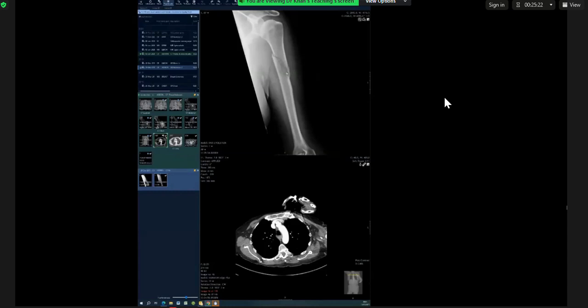So describe the fracture. Always say displaced, not displaced, stable, unstable, if that applies. It doesn't really apply here much, but you can say that there are cortical breaches on both sides. And you rightfully said there is a lytic lesion. Straight away you said the bone is normal, and then you said it's abnormal. Like I said, always with the fracture in a VIVA, there's something wrong about the fracture. It's not a simple fracture.